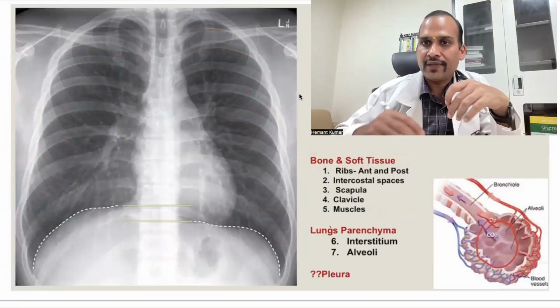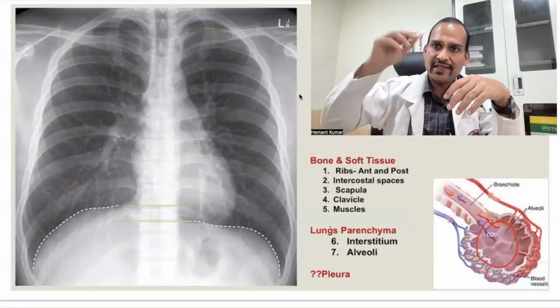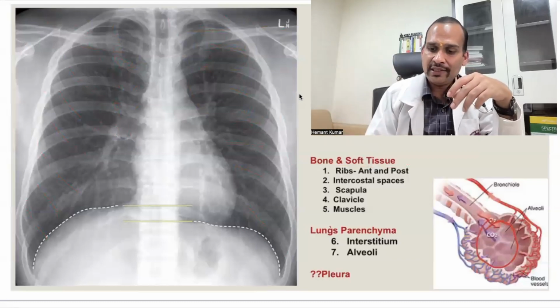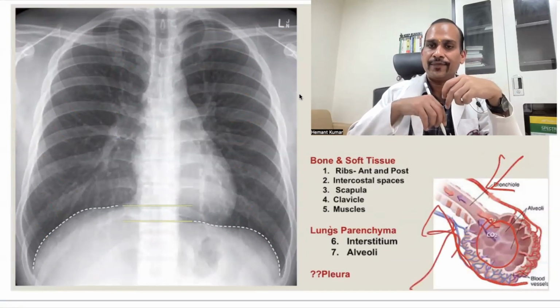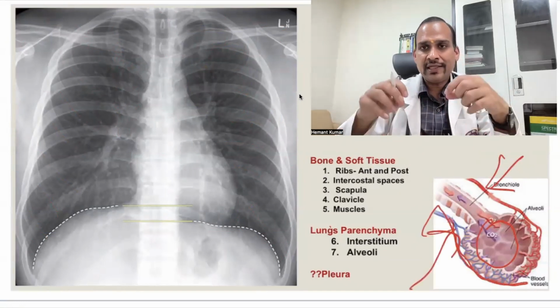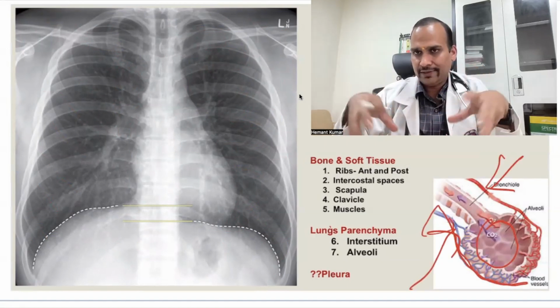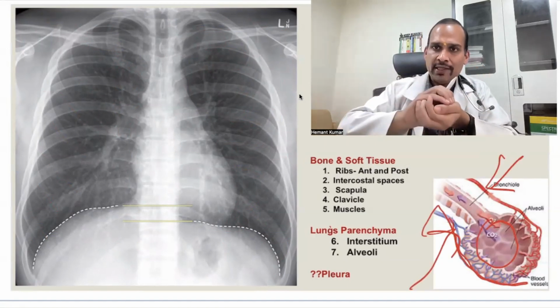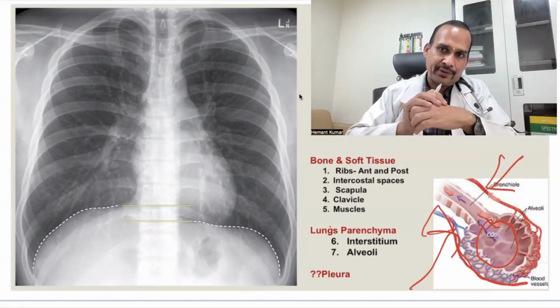One is alveoli, which is having gas and taking part in gas exchange. Another thing is the surrounding of the alveoli is blood vessels. See, you can see blood vessels. Okay, blood vessels, and there is connective tissue which is protecting alveoli and lungs. So surrounding alveoli is blood vessels and connective tissues.